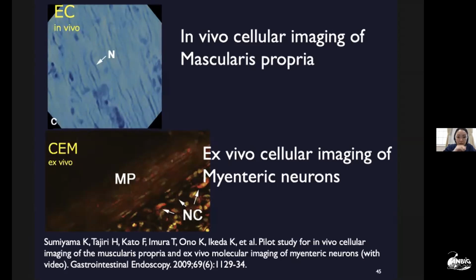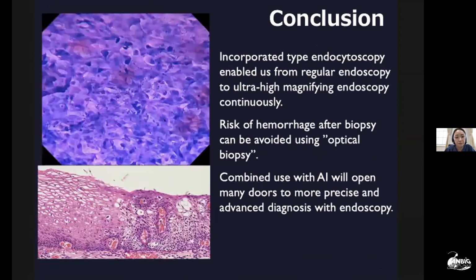The lower picture is ex vivo cellular imaging of myenteric neurons, and this is very interesting. It may lead to some new knowledge with this kind of work.